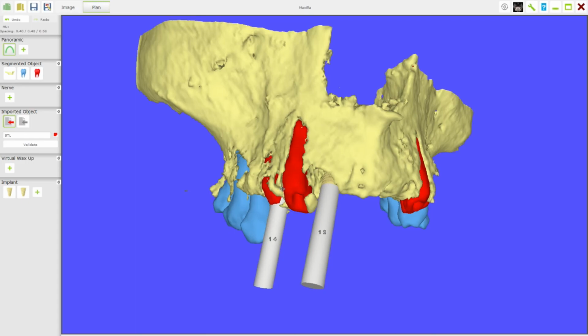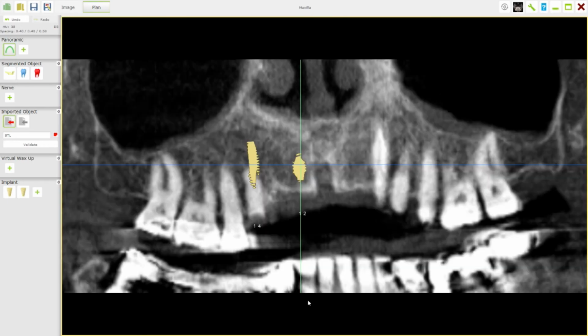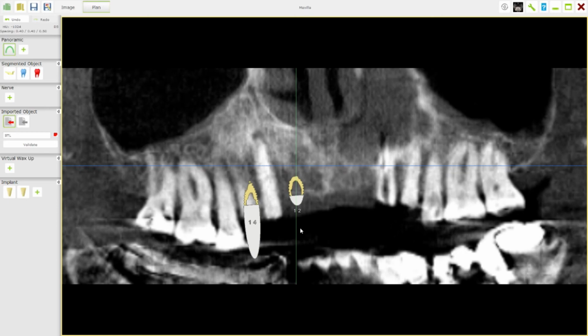That's often the case. And if we go into the trans-sectional view, and I'm going to go back to the pilot view for that, I'm going to scroll, I'm going to see my canine, and I'm going to click just above the canine, and now the green line shows us that's the slice, that's a trans-sectional slice. This is showing us the actual slice, which is quite high up, but I'm more interested in this green line because I want to see the trans-sectional view in this area.